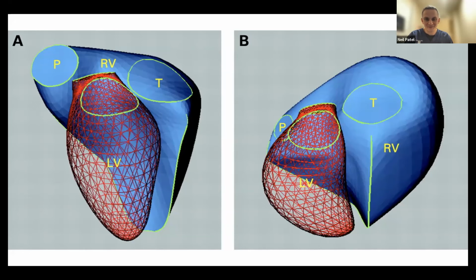The left ventricle is almost easier to get our heads round, because certainly, as you see on the panel on the left-hand side, it's a relatively symmetrical structure, which has certainly from the bottom third downwards, this kind of cone shape tapering to the apex, and relative symmetry to that structure. If we look in cross section, as you know, it's generally circular in cross section from the base to the apex. So that describes that symmetry of the ventricle.